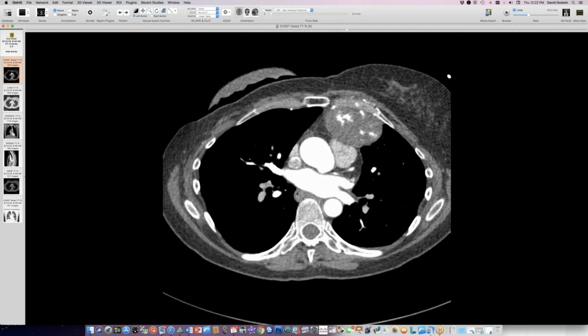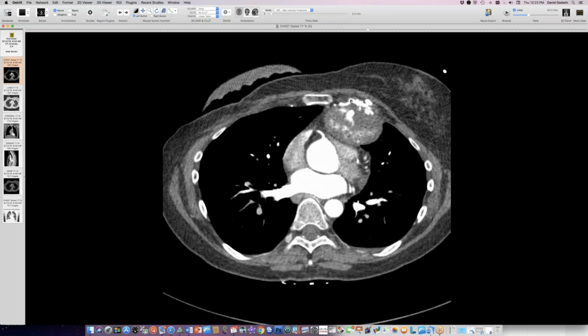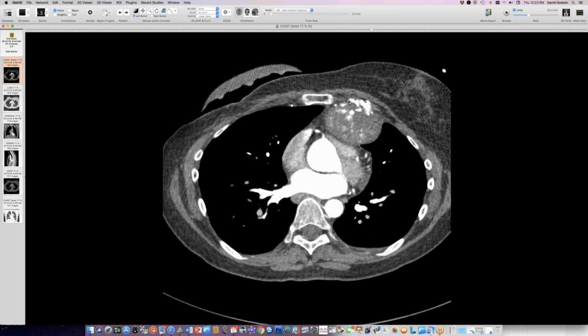See all these things. Oh yeah, going through the rib cartilages. Yeah. But maybe internal mammary branches. It looks like maybe. Yeah, right there. Okay.